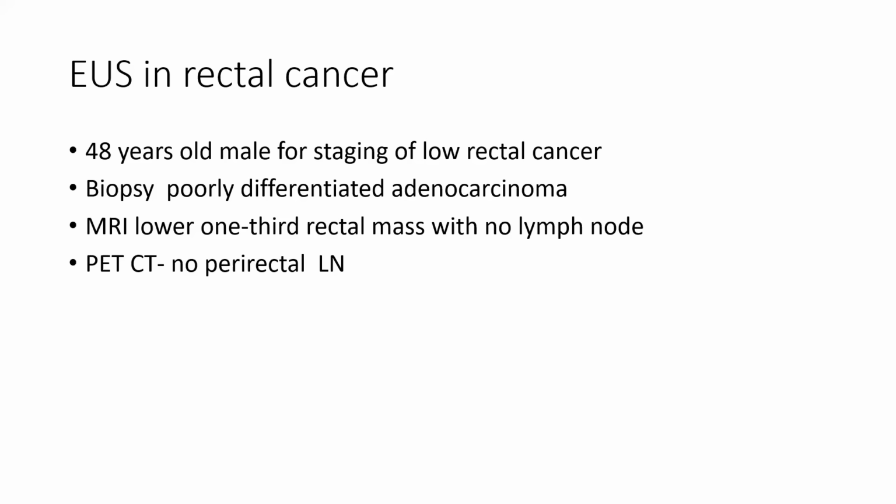Now, as I said, because I cannot speak in too much detail about each cancer, even in rectal cancer, I think the rectum has got a particular thing. It has got the mesorectum, and the tumor goes there. When you remove a gastric cancer, we remove the ligaments along the gastric cancer. But along the rectum, there is a big, thick fascia all around, and the ligament of the rectum is the mesorectum. And we need to remove the entire mesorectum surrounding the rectum. So this is a rectal cancer case.